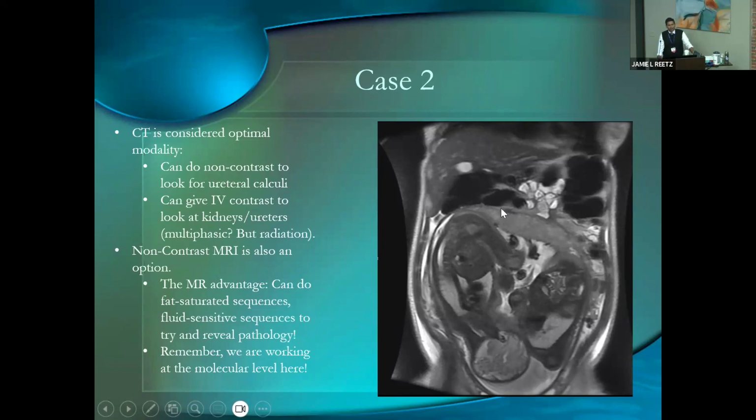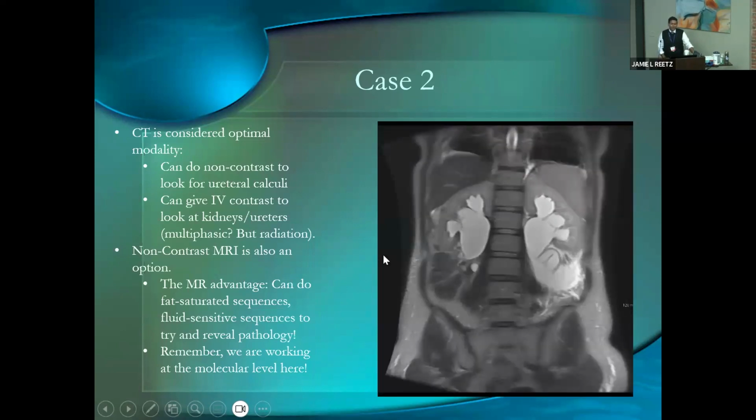I just did this because I wanted to send this to the patient because it'd be like, if these twins ever give you crap, just remember that this is how big they were, crushing everything in your body. And so this is what she looked like. So she had severe bilateral hydronephrosis. And again, pregnancy, physiologic hydronephrosis of pregnancy, usually right-sided, usually not this bad.